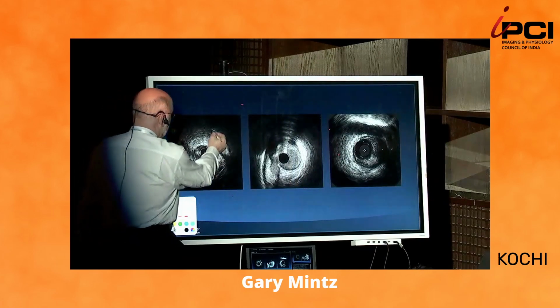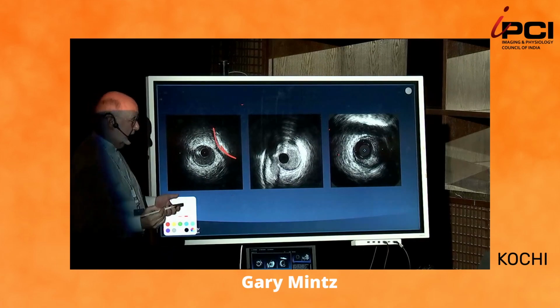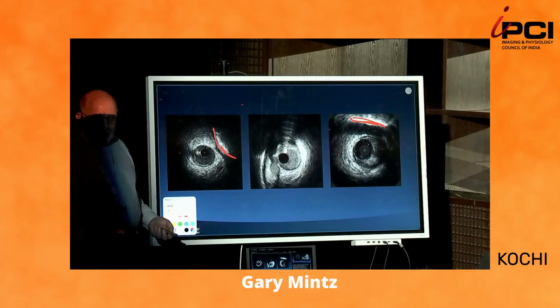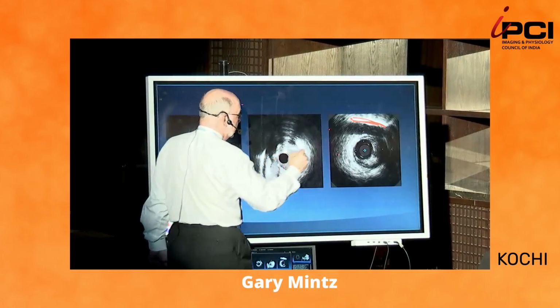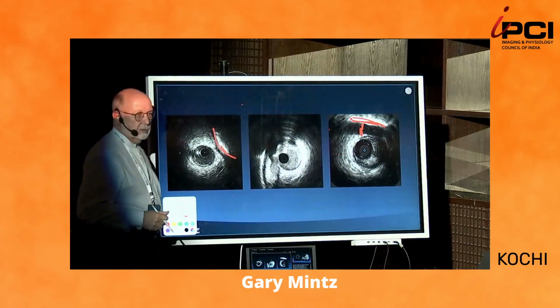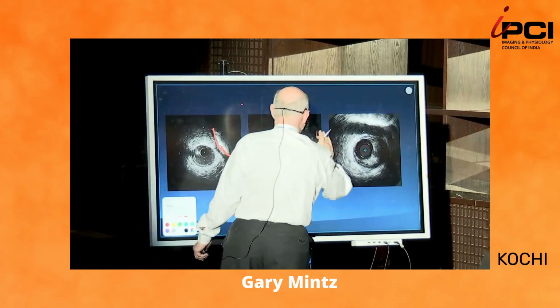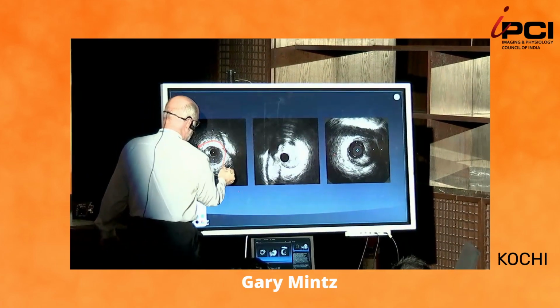Okay, so remember, what is the pericardium made out of? Fibrous tissue. It's bright. What is a muscle bridge? It's muscle. It's not bright. And depending on how much pericardial fluid is there, this distance can sometimes get kind of large. It doesn't mean that there's a huge amount of fluid, because remember, this is only a millimeter. Okay? So the big thing is pericardium is fibrotic, and it doesn't hug the vessel. Okay?